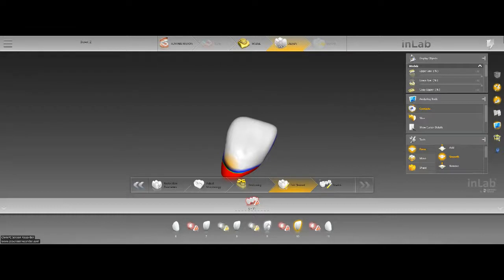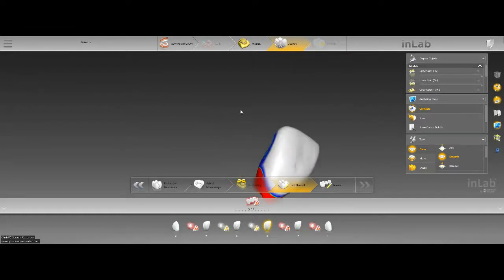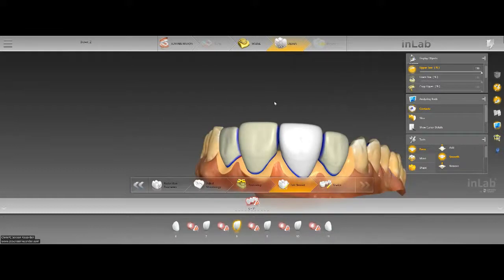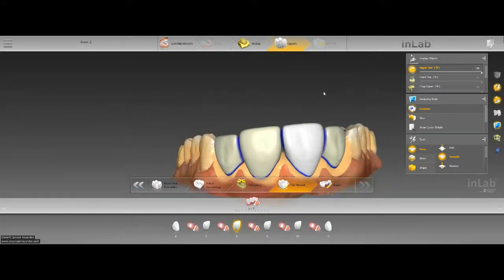All right. Let's go to 9. We'll go to the mesial. And I'm just using the smooth tool, and I'm kind of counting my clicks. 1, 2, 3. Perfect. Perfect. So now we have red exclamation points everywhere, which is going to allow us to carry out this next step in Mesh Mixer flawlessly.